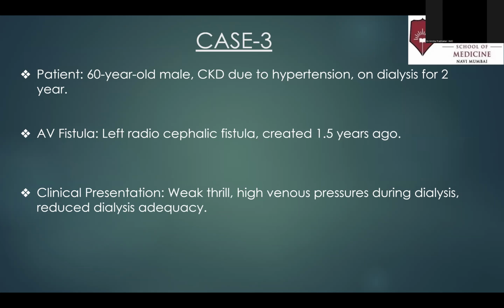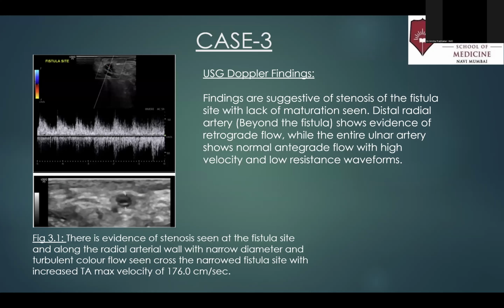Our third case was a 60-year-old male patient, CKD due to hypertension, on dialysis with a left radiocephalic fistula created 1.5 years ago. Clinically, there was weak thrill, high venous pressure during dialysis, and reduced dialysis adequacy. When we did our Doppler, we identified a stenosis at the fistula site, and the velocity, the TAMAX, was 176 centimeters per second, with lack of maturation.